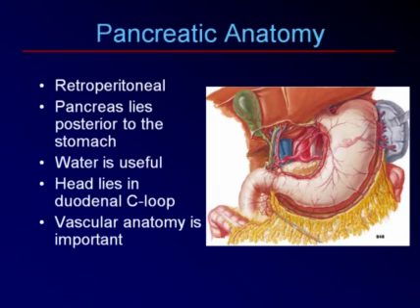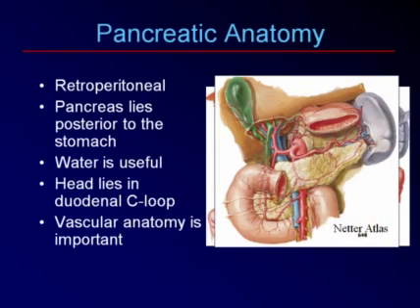Now here we're going to peel away, cut away the stomach, and right behind it is the pancreas. Notice how the head of the pancreas is hugged by the C-loop of the duodenum.